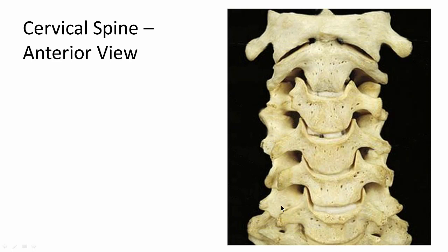Here's a much wider one here. You can see this. I think we have a quiz on this one. Okay, there's your anterior tubercle, posterior tubercle. See the difference? This one is much more narrow. So this patient may be prone to more radiculopathy or radicular pain because of this. And let's look at this uncinate process, right? See how it's starting to hook a little bit? Some of these patients have really big spurs going right into these, like a sheep horn going right into the IVF.